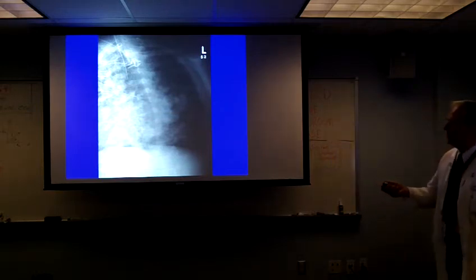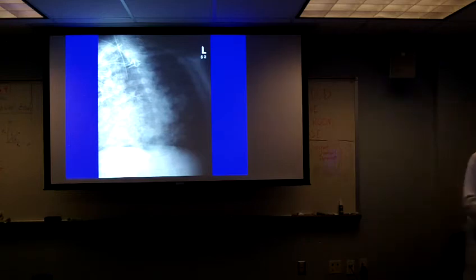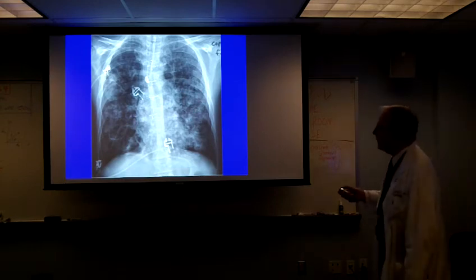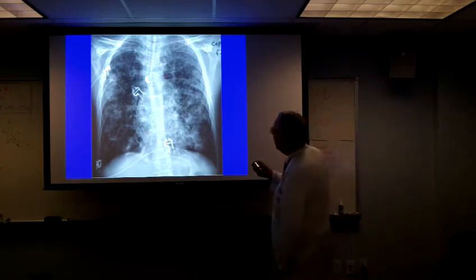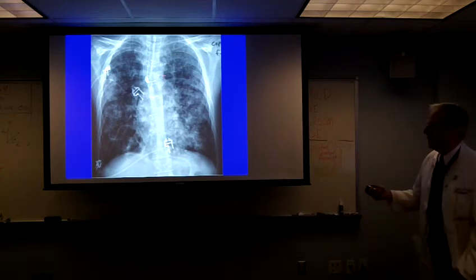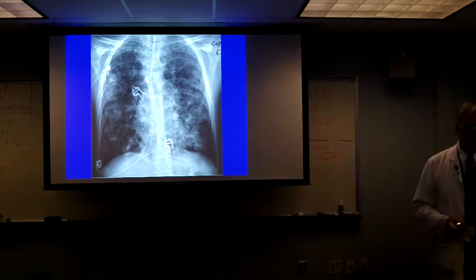But what happened to our tooth? We don't see it. He was lying on it. No? Nope, it's on his chest. Come back and look at this again. See a little thin white line here and here, and a syringe. Oh, that's exactly right. Yeah, it's a plastic syringe, and the only thing that's radiopaque on it is the stopper.